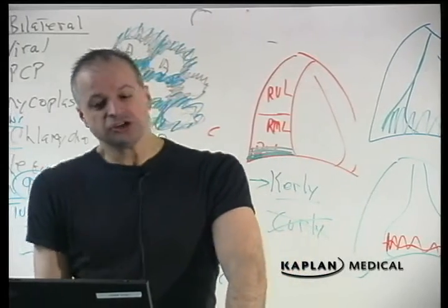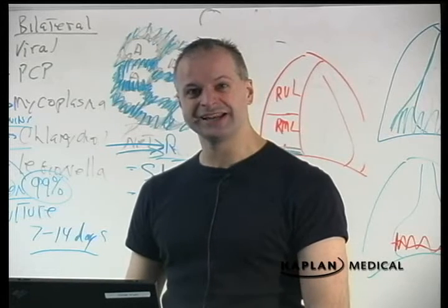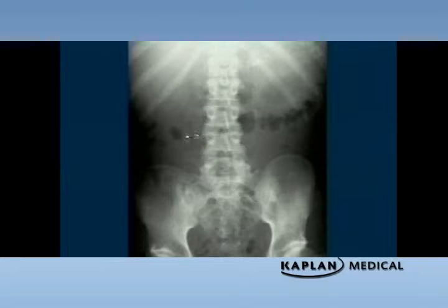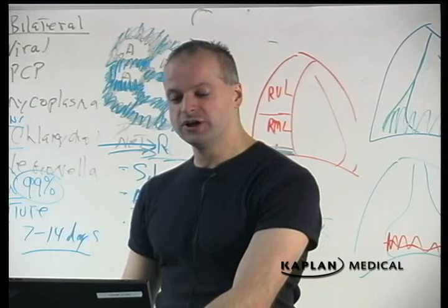There's straight lines. There is very little that's natural in the human body that has perfectly straight lines. Most things have a curvature to them. So it is not much that's naturally straight inside the human body. Naturally, it's curved. So the bowel gas pattern, as we've looked in our previous films, there's no straight lines there because there's no air fluid levels because everything's going forward. Whereas here, there's no forward movement. This is an ileus or small bowel. Straight line, air fluid, air fluid. This is a barium enema.